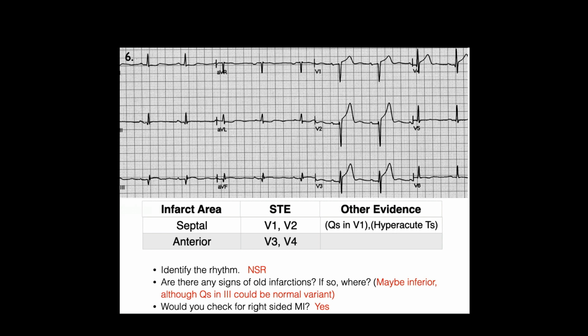I will mention to you, this is the second one that it's come up in. Something that we're going to learn in 2 weeks is that something to be suspicious of is when the first part of the ST segment and the T wave sort of straighten out, which is hard to see because it's so small. So I'm seeing that, and it would be really interesting to see this one. If it is, it could easily be an inferior STEMI that's progressive. But I still think the Q waves are probably old, because there's not good ST elevation there. Okay.